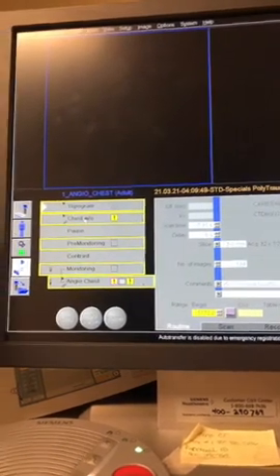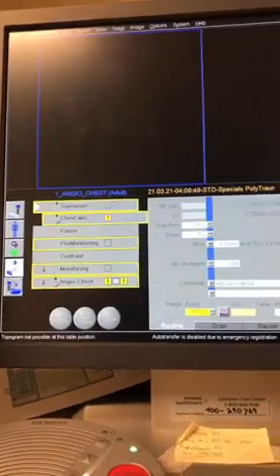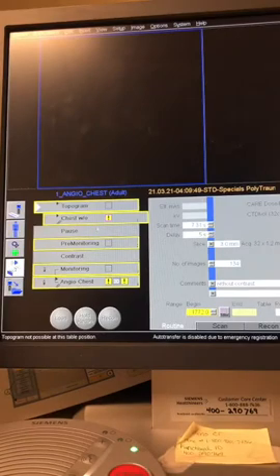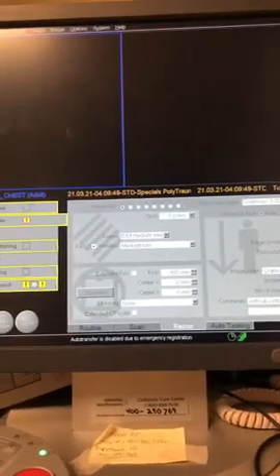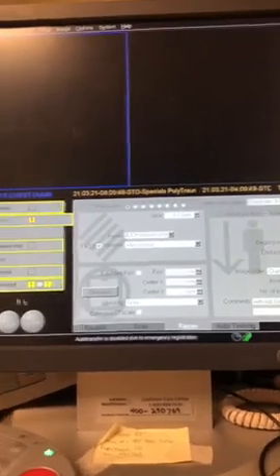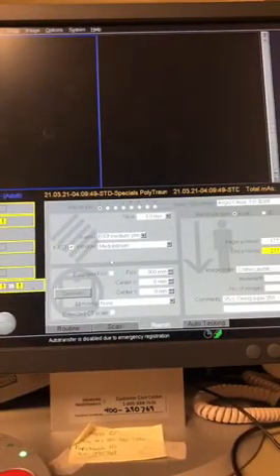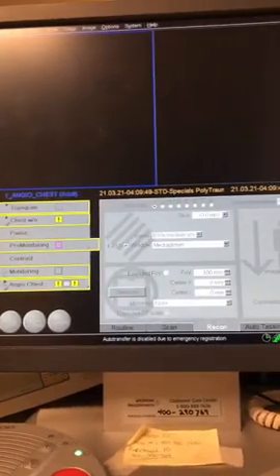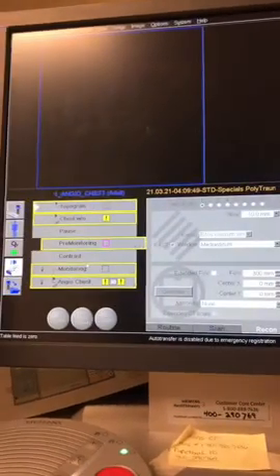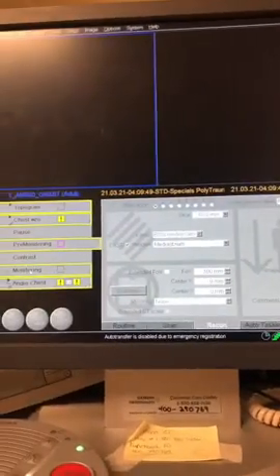So the scan of the without chest is just a regular chest scan, okay? Apices through the lung bases. It's going to be like 3mm, just like kind of everything else, and the reconstruction looks like every other chest we've done, right? Okay, so if we go to the angio, same thing here. All right, 3mm, all that. Let's look at the timing on this one versus the other one, okay? So we set our pre-monitoring slice. We're gonna put that in the descending aorta, which the other video will reference for you.